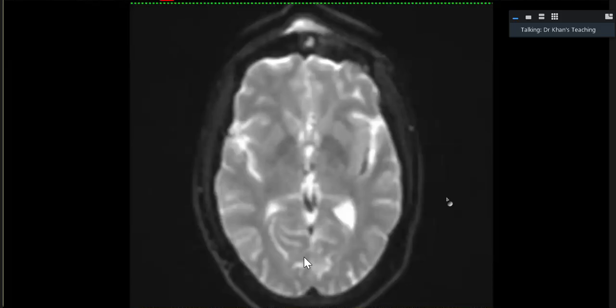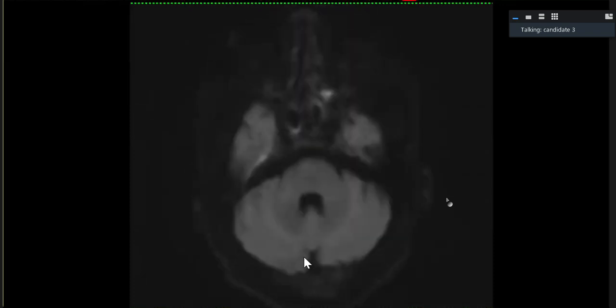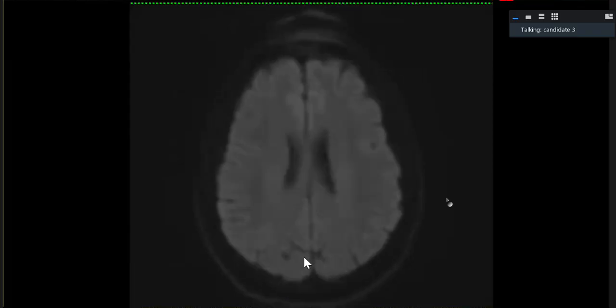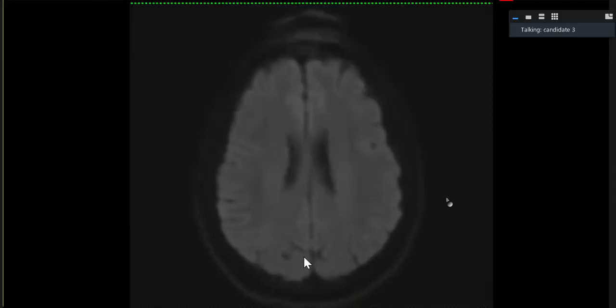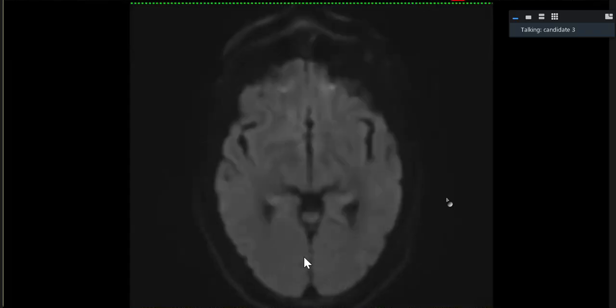Diffusion. Scroll through, you will come to the diffusion. This is the T2 component of the diffusion. Yes, sir. So on high B value diffusion weighted images, I can see that the lesion shows central high DWI signal, which I will correlate with ADC for presence of true diffusion restriction. Similar high signal is there in the underlying frontal sinus. So if it is showing true diffusion restriction on ADC, my first differential will be an infective process, which can be sinusitis with osteomyelitis and Pott's puffy tumor appearance.